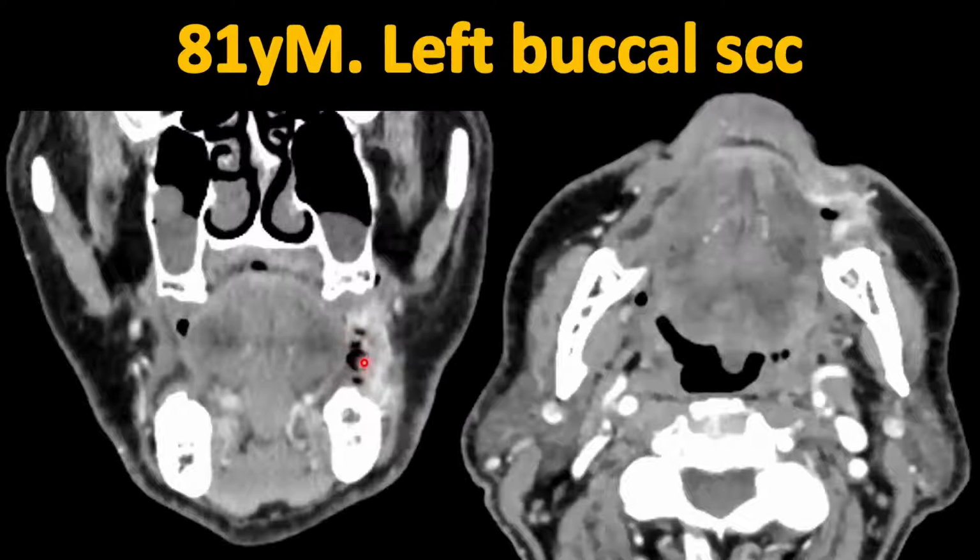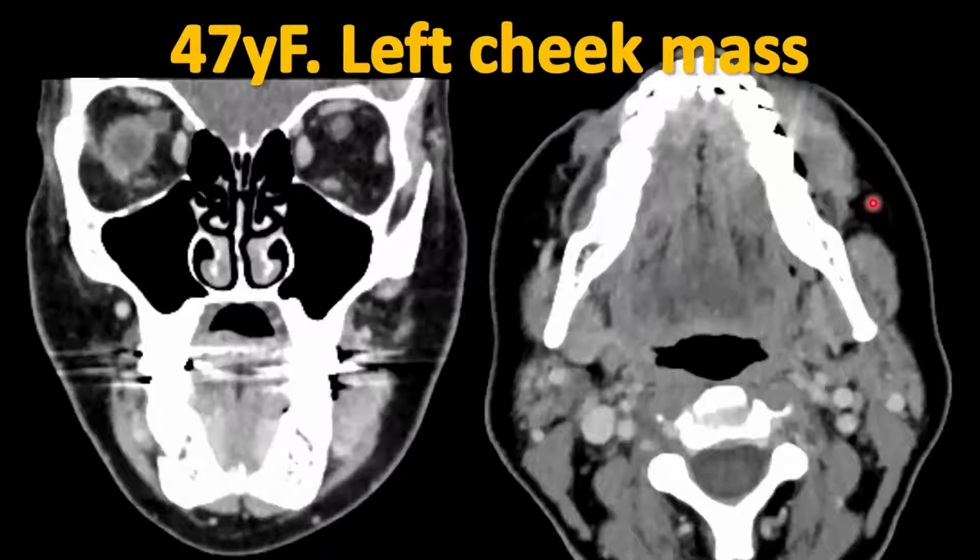And here's that little air in the coronal plane coming back at this level here. And here's our buccinator muscle. And here is the primary malignancy, which has a tendency, obviously, to spread laterally. It's going to spread laterally out into the soft tissues in most cases. And this one was completely resected on all the nodes. Levels 1, 2, and 3 were negative.